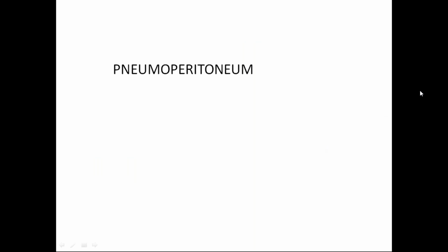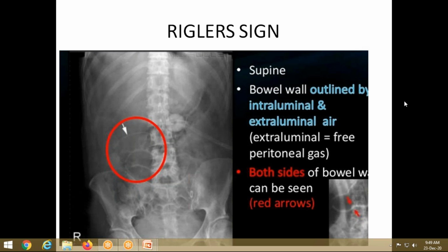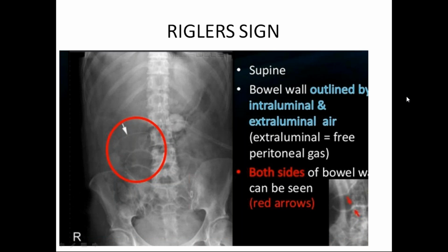And then in case of intestinal obstruction, we can also suspect intestinal perforations. And in that case, the telltale sign for an intestinal perforation is pneumoperitoneum. And what we usually see in an erect abdomen X-ray is the air under the diaphragm in case of a pneumoperitoneum.